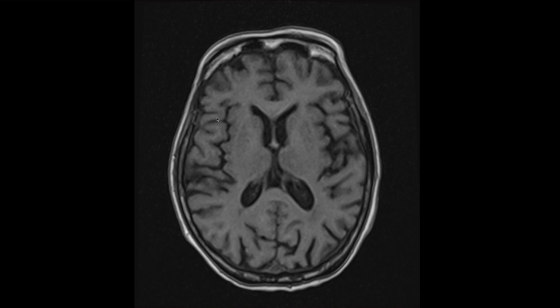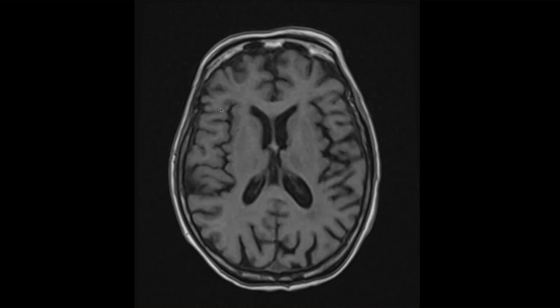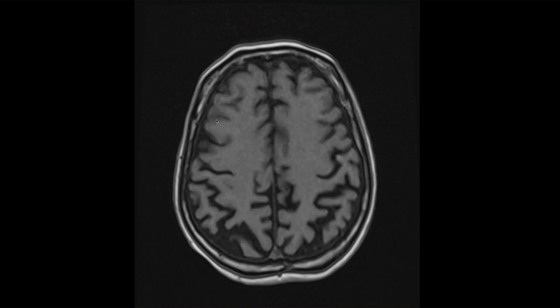In a 2D acquisition, you collect just one slice at a time, going down the body, either in the sagittal plane, coronal plane, or axial plane. What this means is that with a three-dimensional image, you have better reformats, and you have more true volumetric pixels.